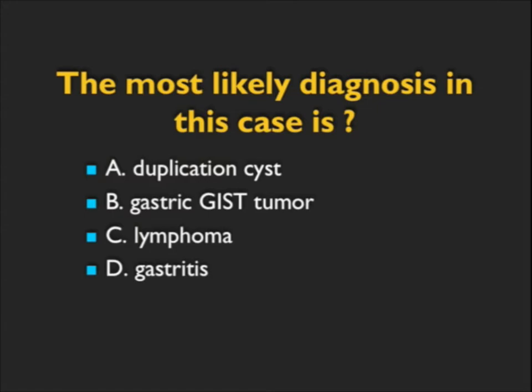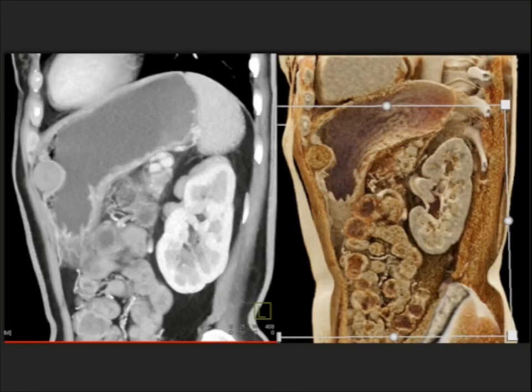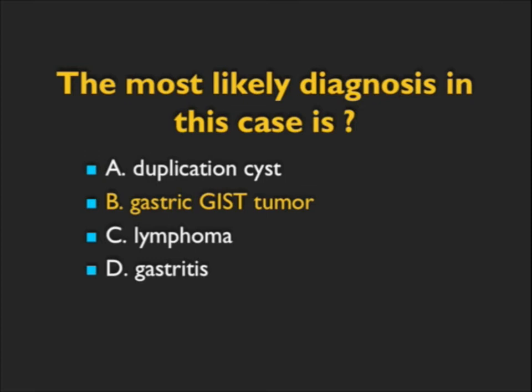Best diagnosis in this case, showing you a very nice image, sagittal view, volume rendering, and cinematic rendering. You see a well-defined mass, exophytic in location, beautiful visualization on the cinematic of the gastric folds. This is one of the classic tumors. It's an exophytic lesion off the stomach. That's a GIST tumor. There's no second guess. There's no second choice. Beautiful example.